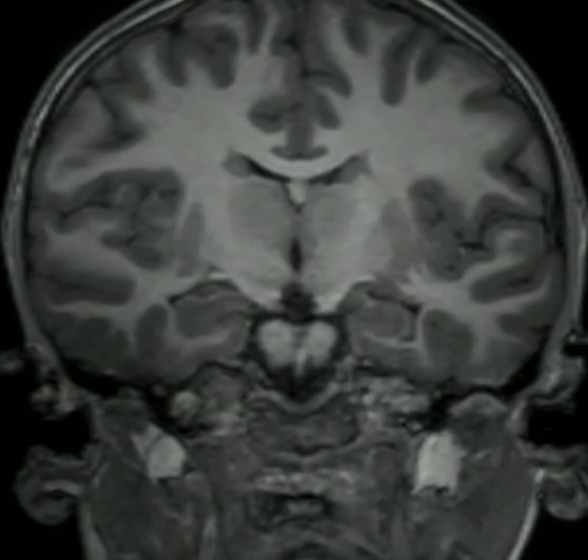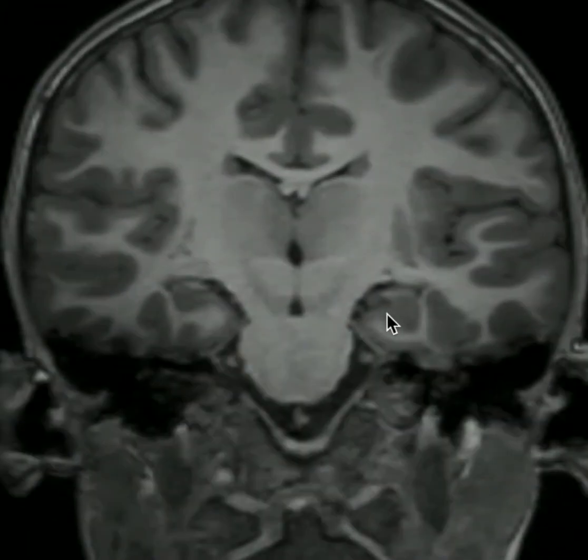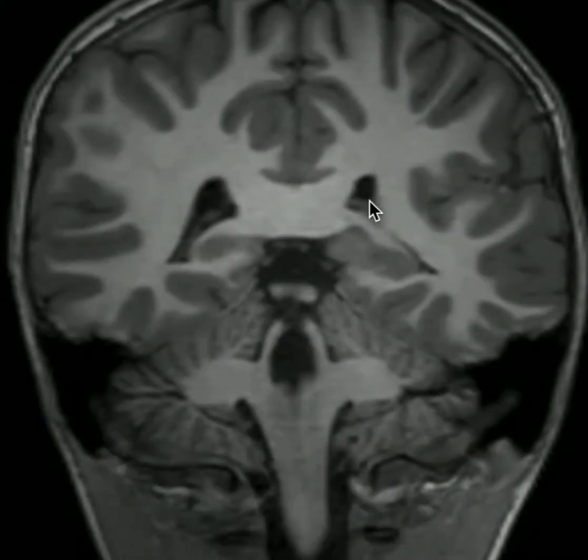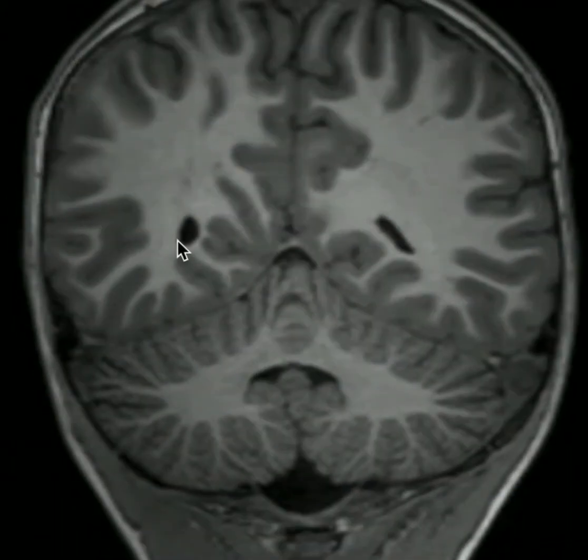The last item to touch on before we move to the axial images will be the cerebral ventricles. Here we have our right and left lateral ventricular bodies. Down here we have our temporal horns of the lateral ventricles, which as we mentioned are adjacent to the hippocampal heads. We can follow these posteriorly back into the trigone region, here and here. Sometimes these are called the atria of the lateral ventricles. Further posteriorly, we'll see our occipital horns of the lateral ventricles here and here.